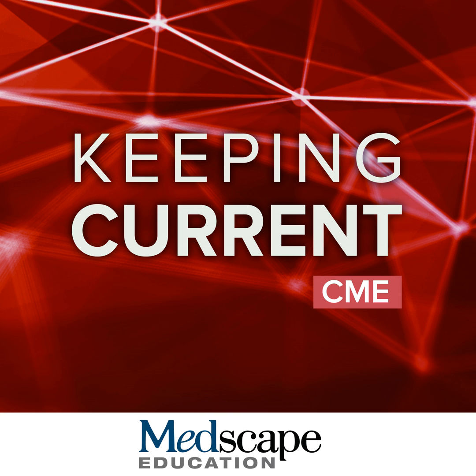So the essence of delayed enhancement is around being able to image the heart where you get gadolinium retained in abnormal fibrotic tissue, but also at a time point where it's accumulated in enough of a quantity to allow you to image that area of abnormality with high signal.